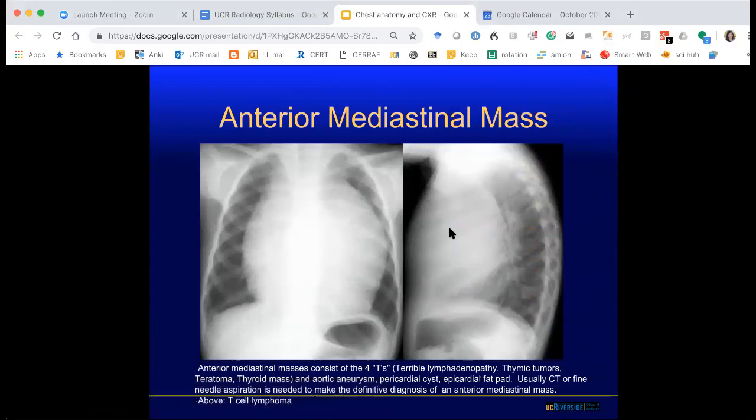Why? Yes, it's anterior. Why? In front of the esophagus. Yeah, so where is the esophagus? In the anterior or middle mediastinum? Middle. Yeah, it's in the middle. So we know it's anterior because the retrosternal airspace is gone. Normally behind the sternum, you should have air. And here the air is effaced because of this mass. So it's an anterior mediastinal soft tissue density.